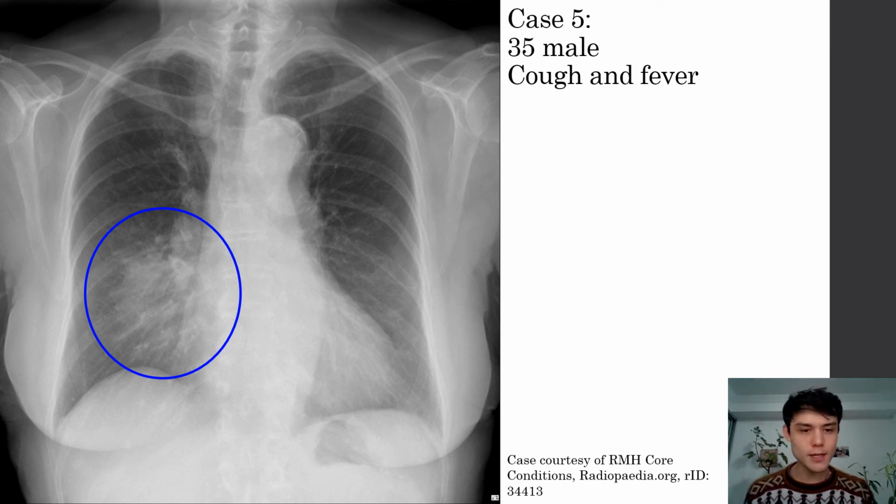It's also worth commenting that you can see some air bronchograms, like you can also in pulmonary edema, and you can see them running through here. We can comment on the silhouette sign as well, where we get the loss of the right cardiac border. And in general, we can notice that when we get an interface between two materials in an X-ray, then if those two materials are the same radiographic density, we will not see a border on that X-ray.